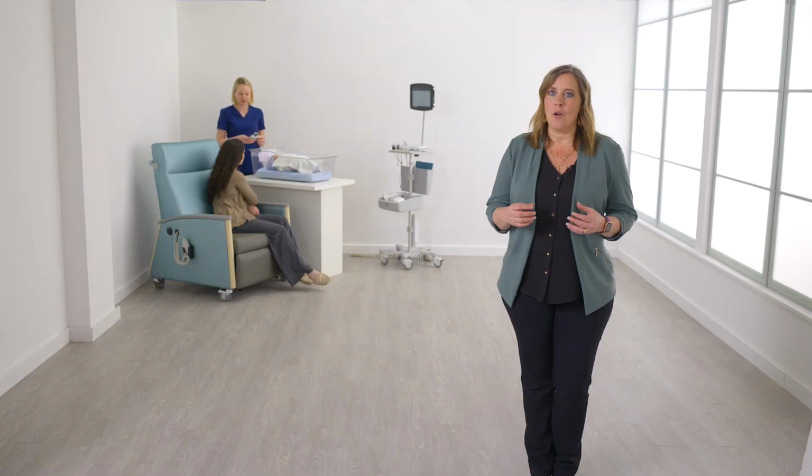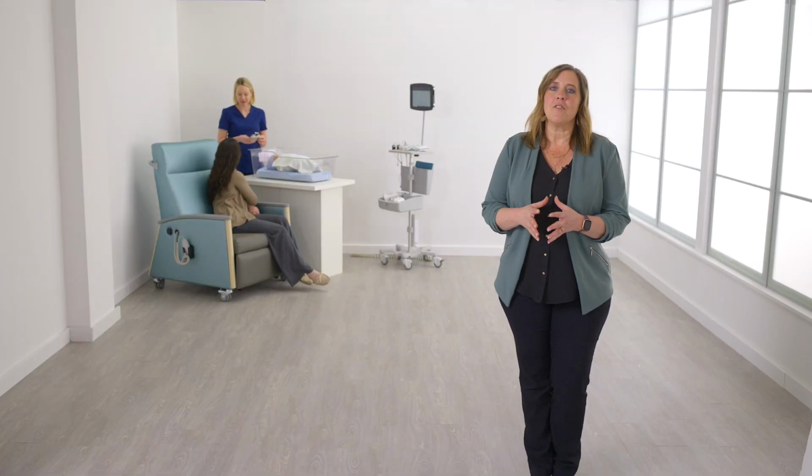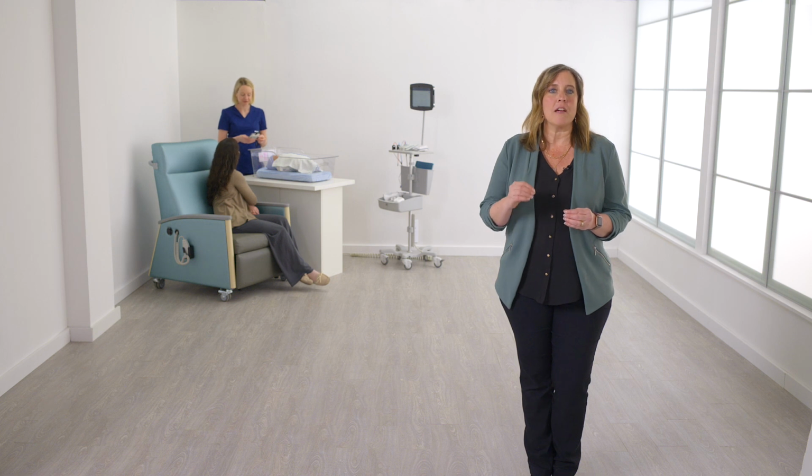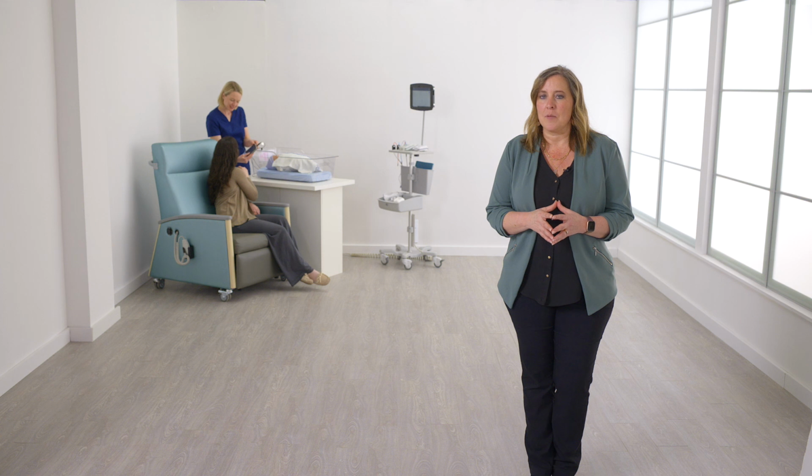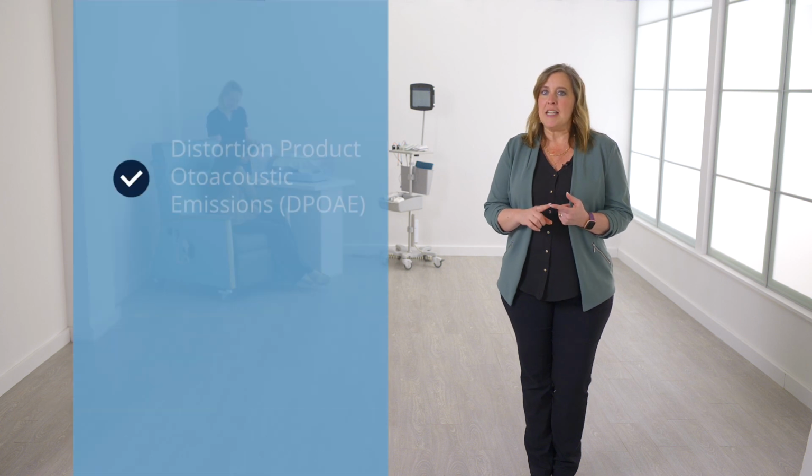Otoacoustic emission testing, or OAE testing, is a method of newborn hearing screening that measures the ear's response to sound. There are two types of OAE testing available on the GSI Novus.